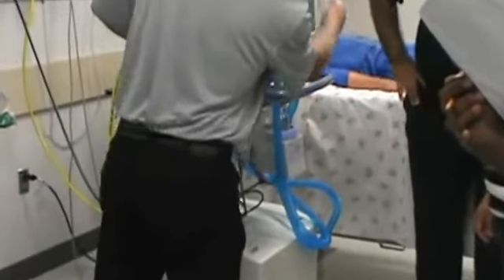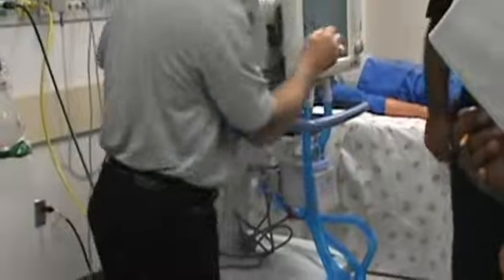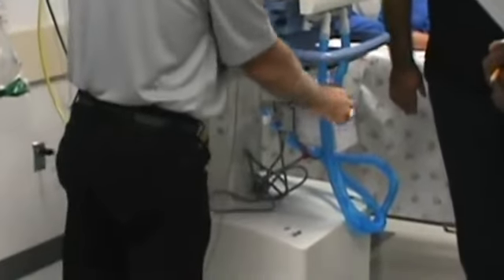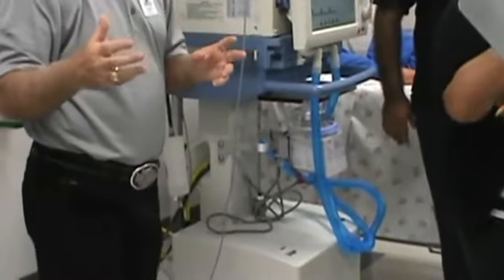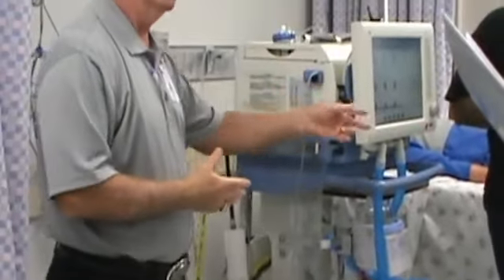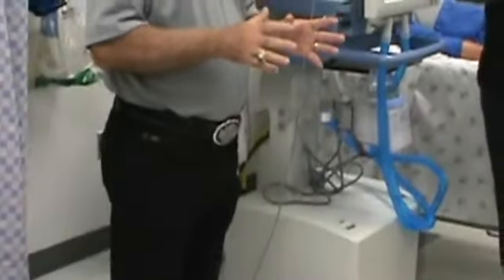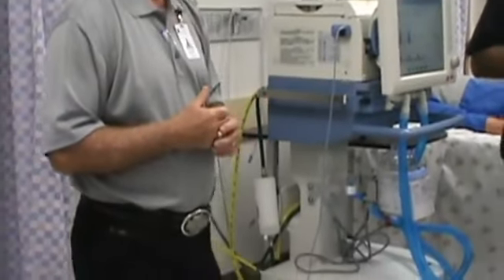Nebulizer, put it in line, and when you hit nebulizer up here, a portion of that tidal volume is sent through this tube and through the nebulizer tube. The Avia does the same thing. So if anybody comes up to you and says, you've got the nebulizer running, isn't that adding more to the tidal volume? No, it's not. The flow through the nebulizer is a portion of that tidal volume.